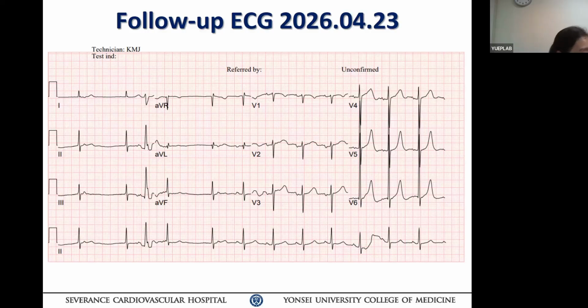This is the patient's follow-up ECG at 1.5 months. There is also a peripheral... you can see in this. There is also a little notch, a bigger notch.